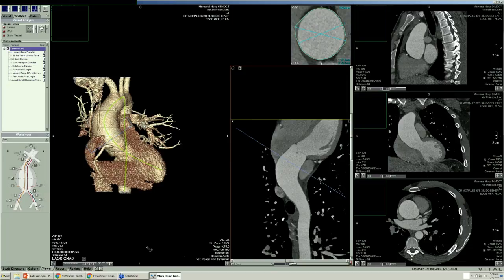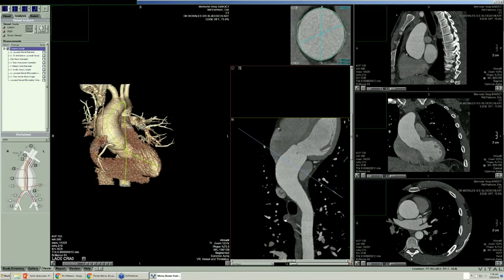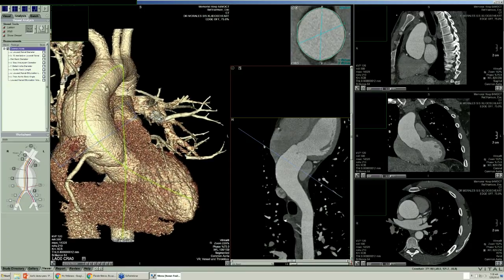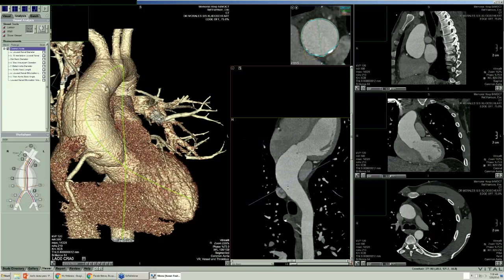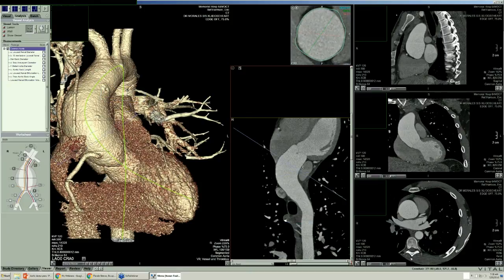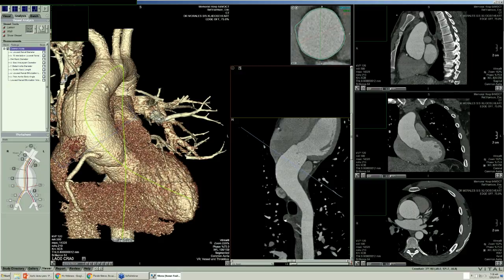And we can get numbers that make sense from one picture to another that are not just numbers measured randomly, assuming that you're tangential and perpendicular. That's pretty cool that we can do that. And then we just take this down. And as I move that along, all the measurements that are being made up here are perpendicular. So let's move that along and see.